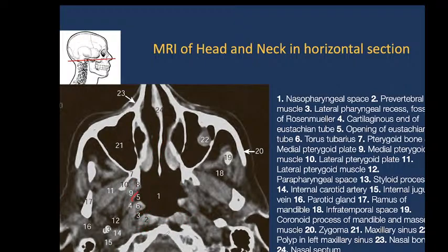We also see that is interesting, number 5 here. This is opening of the Eustachian tube, or another way, this is the auditory tube, the special canal to the middle ear. Another name is tympanic cavity, and it is visible that this is a great communication, acoustic tube or Eustachian tube.